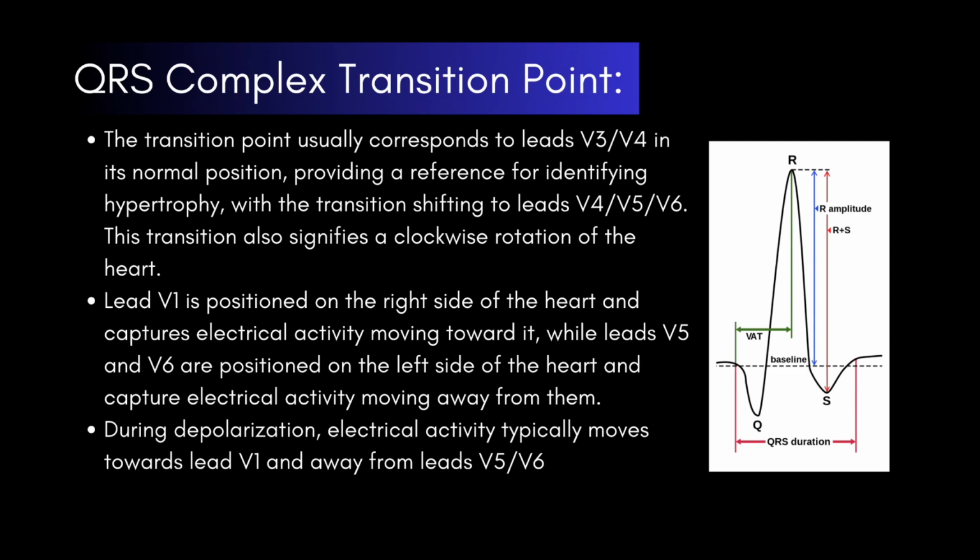We'll be examining this concept of the QRS complex transition point in greater detail as we move along the videos in this series. But just make sure to keep this in your mind for now as we study the QRS complex. Moving on.